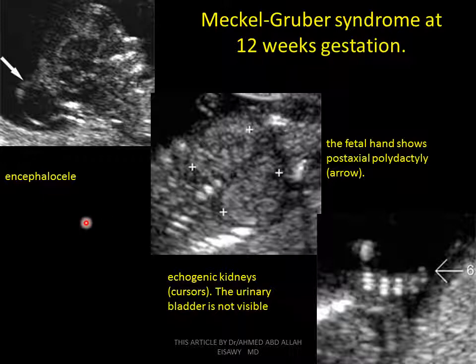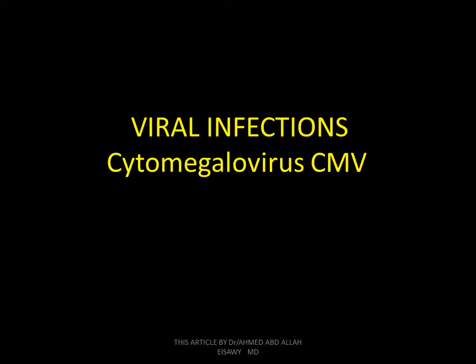Meckel-Gruber syndrome at 12 weeks gestation. Encephalocele, the fetal hand with post-axial polydactyly, echogenic kidneys, urinary bladder not visible. Meckel-Gruber syndrome: echogenic kidneys and urinary bladder not visible. The fetal head shows encephalocele, with post-axial polydactyly. This is Meckel-Gruber syndrome. TORCH infection: toxoplasmosis, rubella, cytomegalovirus, herpes.